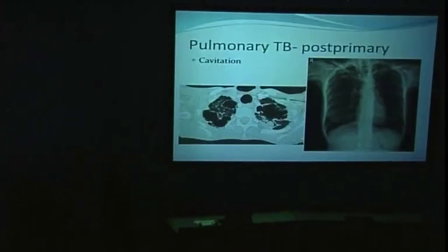Here's just an example, CT through the apices here. This is the same patient. You see there's cavities over here, thin-walled. It's difficult to see. This is in a sort of hidden review area behind the clavicle, very difficult to appreciate. There's a lot of overlapping shadows here. But when we did the CT, we could see that in fact one of these cavities does have a solid ball within it. This was a mycetoma or aspergilloma.